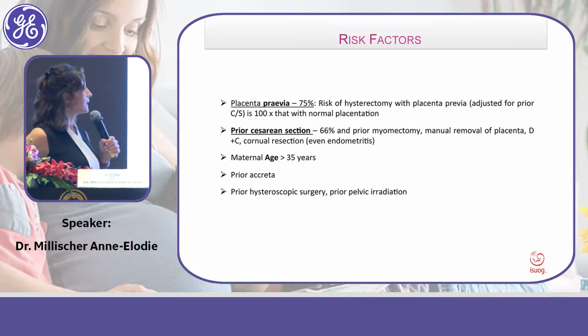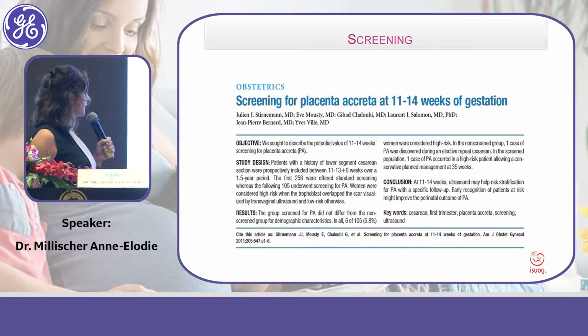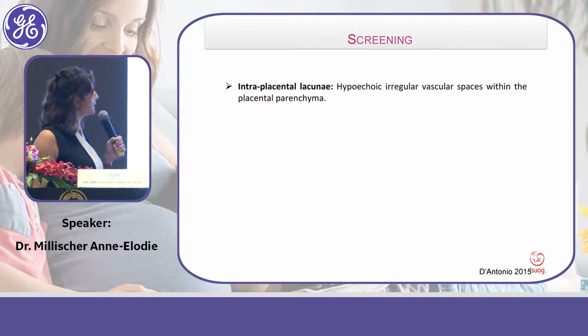Early in pregnancy, we can suspect the presence of morbidly adherent placenta regarding the aspect of the scar, the location of the scar related to the internal orifice. And if you have this kind of placental insertion, you could be sure that it developed placenta accreta.